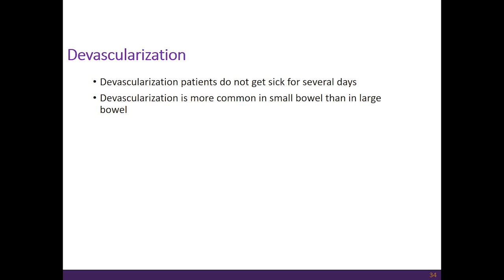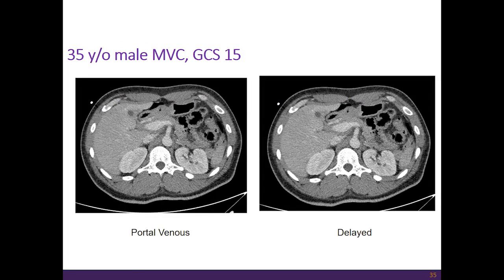So devascularization patients do not get sick for several days, and devascularization is more common in small bowel than in large bowel. And my final slide is this. This was a 35-year-old male in an MVC who had a GCS of 15, right? He should have had a relatively normal CT scan. But you notice on his delayed phase imaging that his kidneys are not excreting contrast.